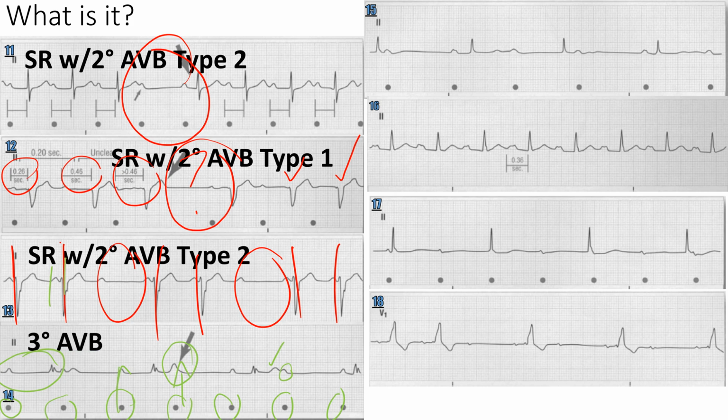What about number 15 up top? Top right. I have a P wave. Whoa, why is the P wave after the QRS? That's a problem. You might think they're associated there, but if you look at the QRSs, that's the regular rhythm. It doesn't look irregular at all. It looks like there's nice and even QRSs, nice and even P waves. If you march them out, you got the P wave after the QRS. This is a what? It's a third degree AV block.